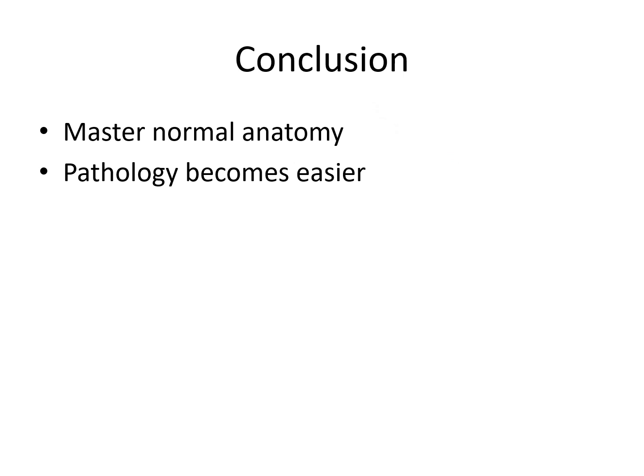Now the conclusion is to make you understand the complete systematic overview of brain anatomy in different sections of MRI. And when reading an MRI brain, always follow a fixed order: visualization of the ventricles, midline structures, gray and white matter, basal ganglia and thalami, brain stem and cerebellum, and extra-axial CSF spaces. So it will make it easier to identify pathology in the brain.